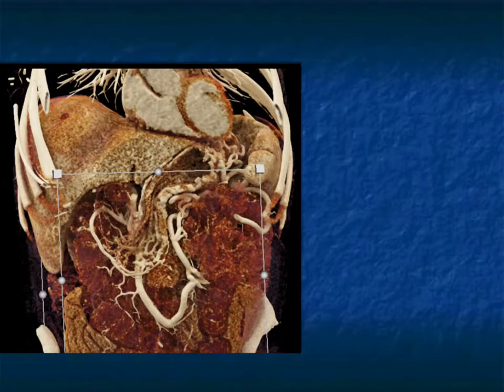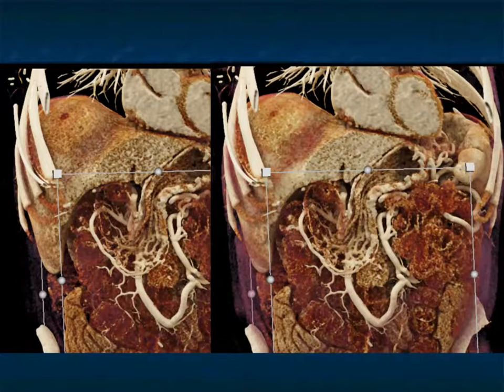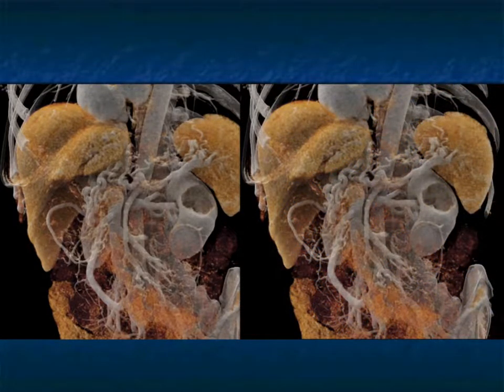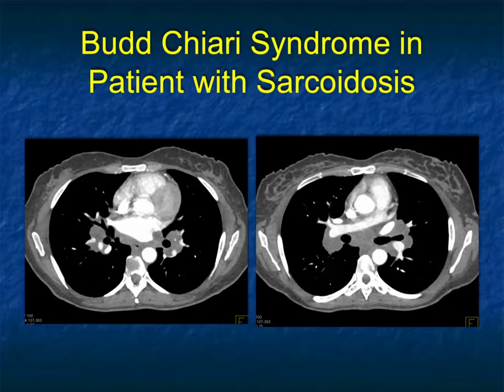Another set of images here, collaterals. You see the stomach well. You see varices in the gastric fundus, varices in the retroperitoneum. We change the rendering parameters again to accentuate the vessels a little bit, increasing the shadowing and increasing the information.